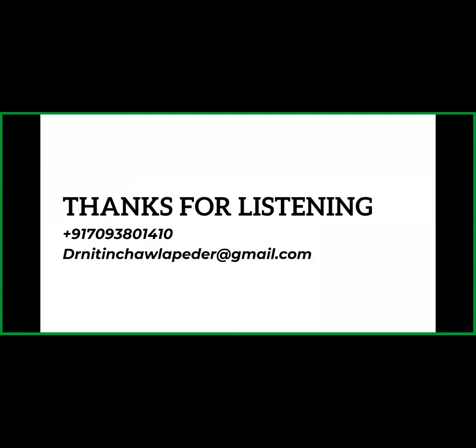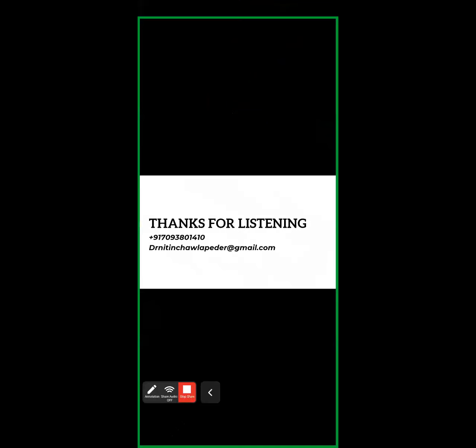With this, I have tried to cover all the normal waveforms in 10 easy steps, how you identify the wave, how you identify in a pattern where you start with rhythm, you decide how is the rate, you decide what is the axis, what is the P wave axis, how is the QRS axis, what is the PR interval, what is the QRS interval, what are the changes in morphology from V1 to V6, and what kind of hypertrophy the child is having or not, what is the time duration that the waveform is going ahead, and how is the morphology of T wave, how is the morphology of other waveforms and other patterns, and that gives us a fair understanding of what we have to keep a note of.